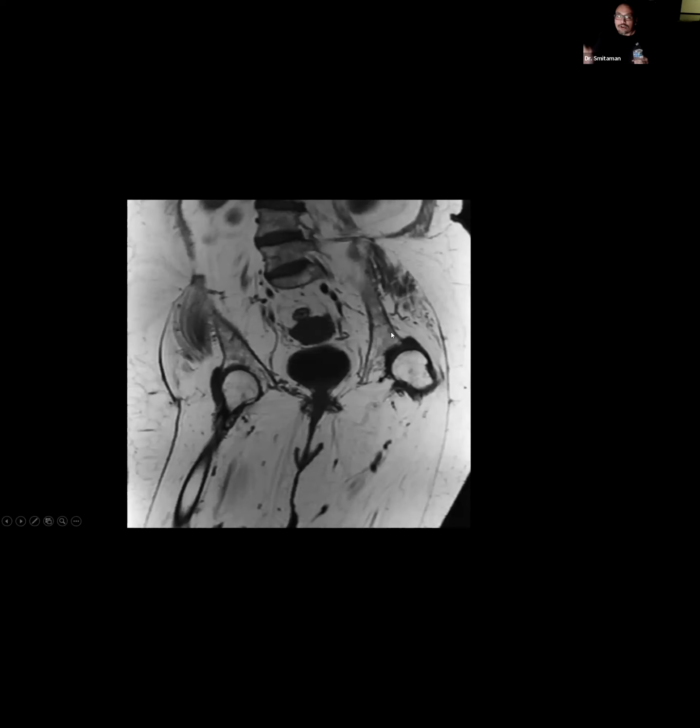And finally, chronic denervation. Anything can look like this. If you wait long enough, whether it's denervation edema, an inflammatory myopathy, what have you, you wait long enough. Sarcopenia, right? We're all going to end up like this, unfortunately, where muscle is irreversibly damaged, atrophied, and I believe this case was a case of polio.